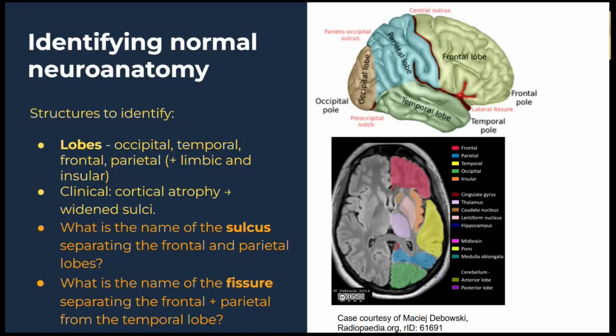And then the fissure that separates the frontal and parietal from the temporal lobe as well.